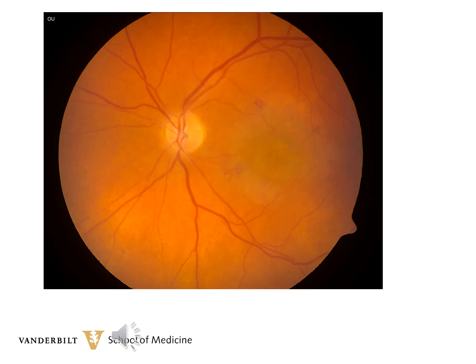This is a 90-year-old gentleman who has had decreased vision in the left eye for 7 months. His vision is only count fingers. There is a gray-green hue to the central macula, and this is a typical color of a classic choroidal neovascular membrane. There's also loss of choroidal markings centrally secondary to the edema. You can see faint hemorrhages at the leading edge of the choroidal neovascular membrane superiorly and supratemporally.